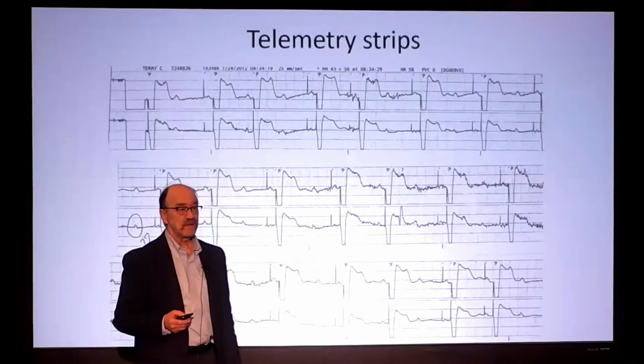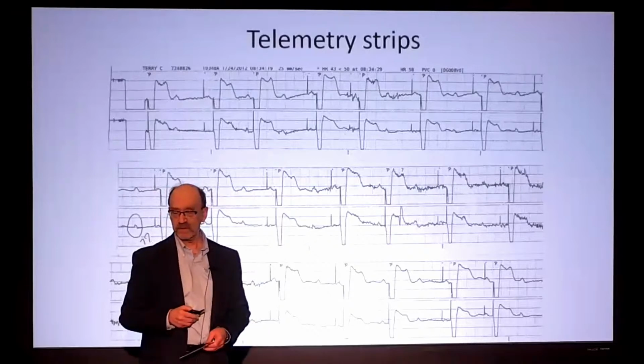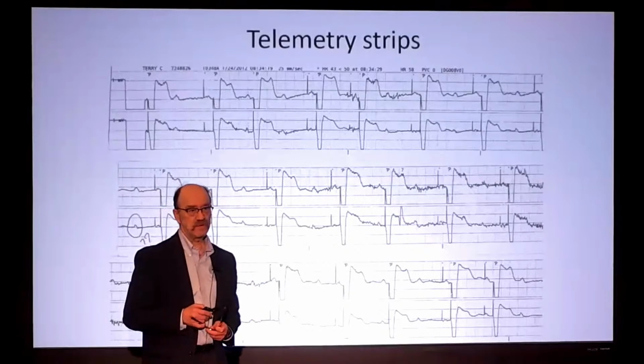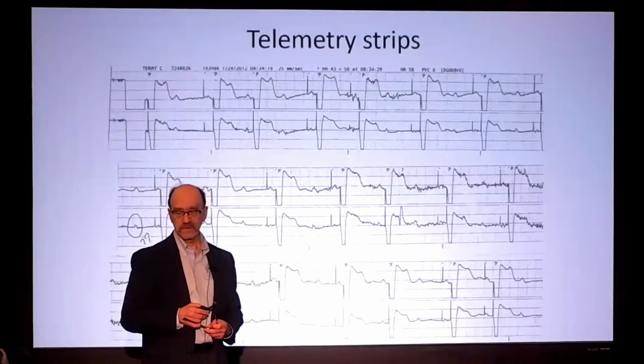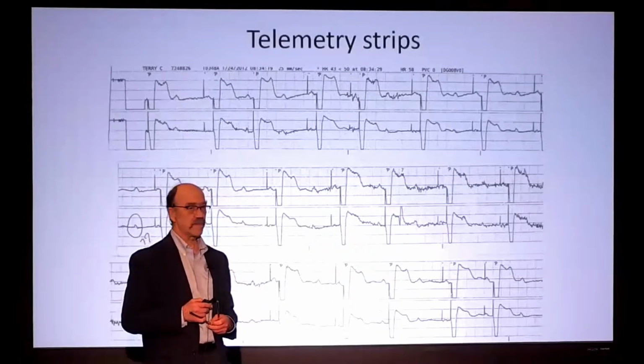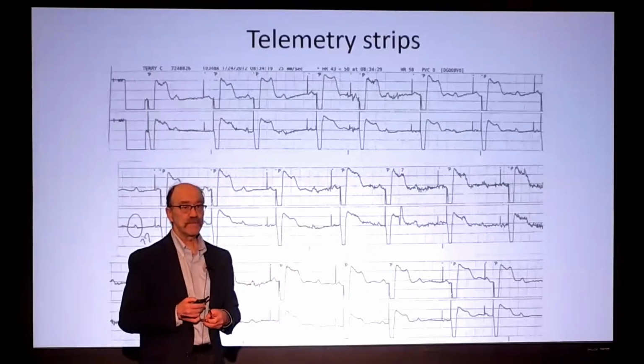So if there's some variability there with the setting, sure, it could be functional. Do you think it's functional? I guess because of the intermittent. It's intermittent, but is it functional, or you think it's a problem with the atrial lead?